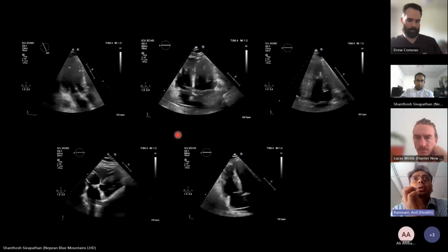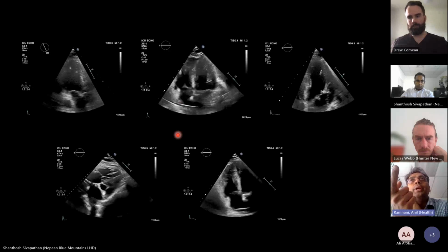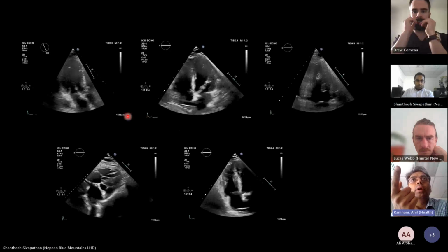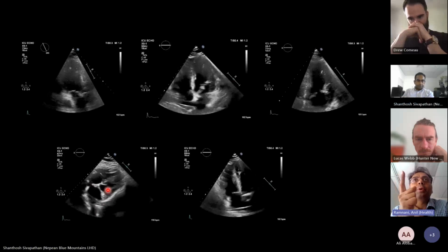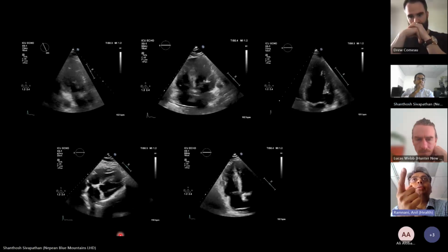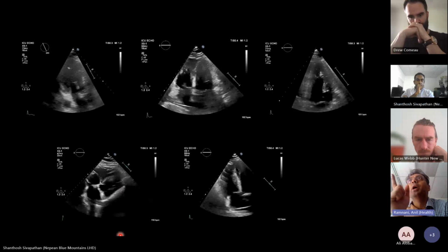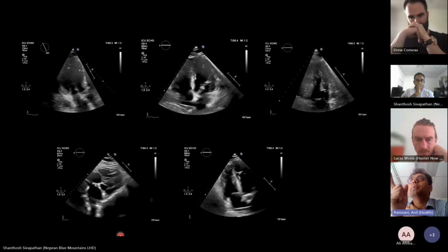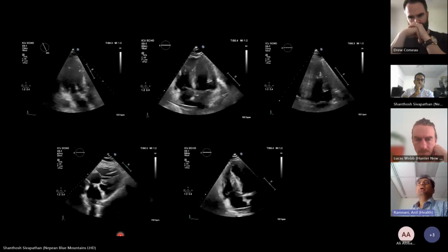And in heart, what view would that be? Image number 4. It's subcostal, I think. Yeah, so that's a subcostal view. In the subcostal view, I think it's off axis because otherwise it looks like a kissing left ventricle, which I don't believe I saw in the other films. But yeah, I think in the third image, the left ventricle seems almost kissing as well. Yeah.